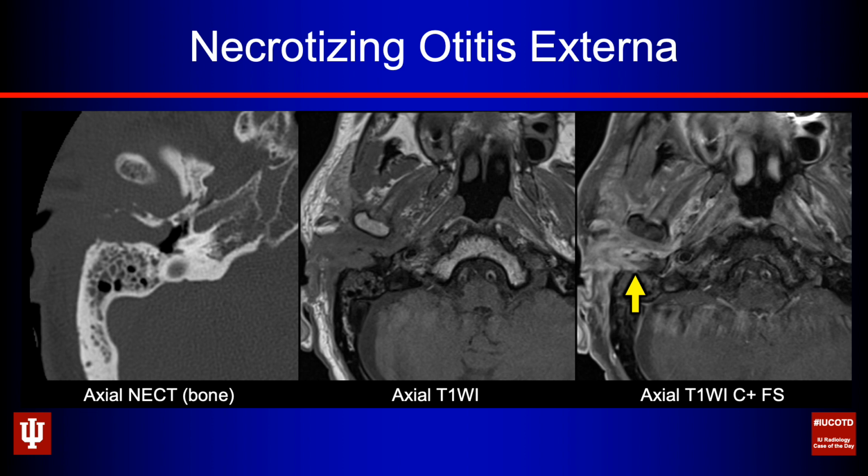Usually these patients are coming to you from an emergency department setting, so it is quite appropriate to do the CT first. This is another time where it's totally fine to give contrast with the CT, so long as in addition to doing the bone reconstructions, you're also doing soft tissue recons. I like to do these at a little bit thicker slices, maybe 2 millimeters. You're looking for complications and tip-offs for complications on the soft tissue.